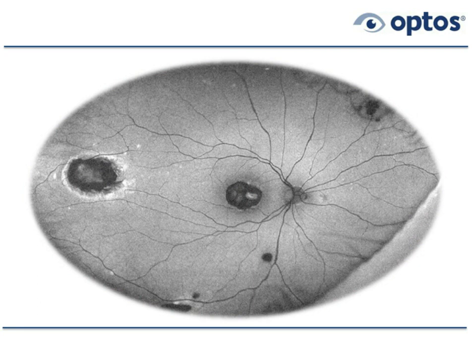But of great interest is that lesion temporally, which has a sort of a bright band around it, the annulus. So it's a dark lesion, hypoautofluorescence, dead tissue. Dead retinal pigment epithelium photoreceptors, but a bright band around it. That bright circular zone around it, the annulus, is actually hyperautofluorescence, telling us that this could be an active lesion. You put a 3-mirror lens on this eye, and you actually see some cells in the vitreous right in front of that lesion. So we assume that it's actually an active lesion.